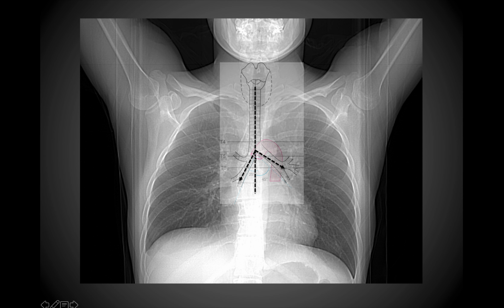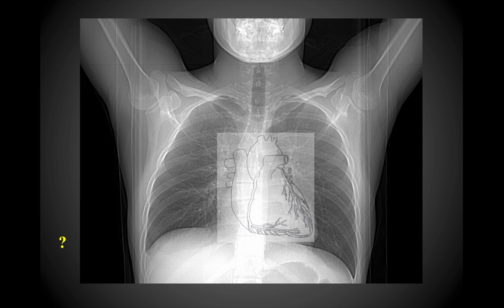And then you'll notice the arch of the aorta. Again, that's forming this aortic knob that you see right here, and that's going to be in close proximity to the AP window that's in relationship to the left pulmonary artery.